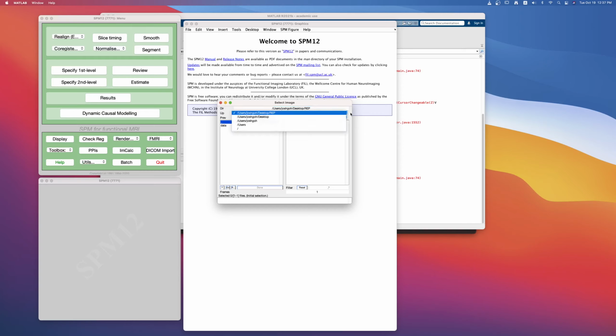You can go ahead and open these drop down menus here. But the key navigation is going to happen here. When you see these two dots, what it means is that if you click it once, you will go to the higher directory, and if you want to go to the REP project folder, you click it once and it will go back down. It's important to know that here you only have to click these once in order to go up or to go down.